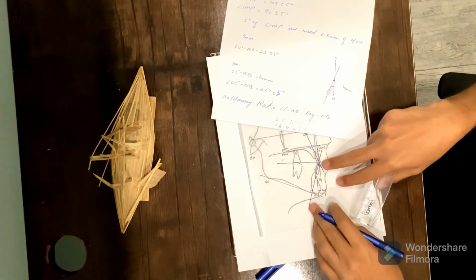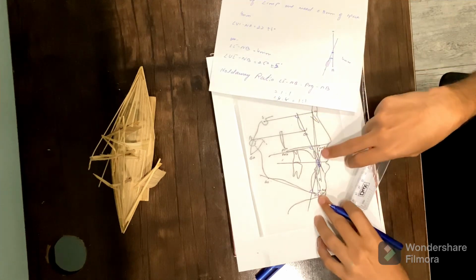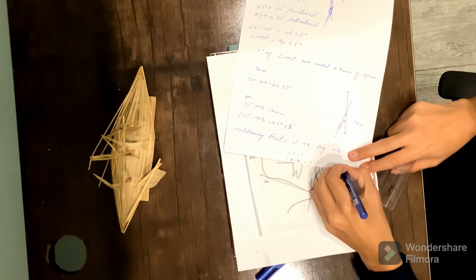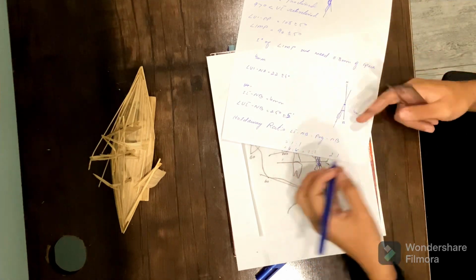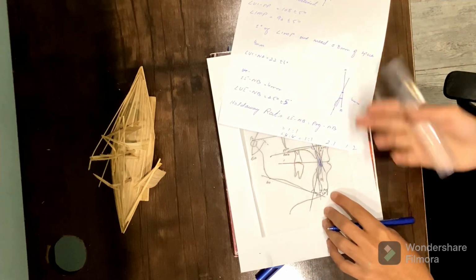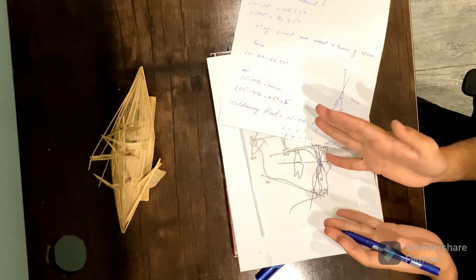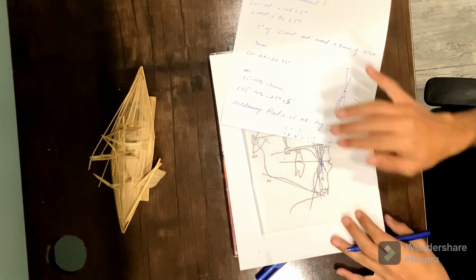So it will tell us the relationship of the incisor and the chin prominence with relation to each other with the help of the NB line. If the ratio is, let's suppose, 2:1, it will tell us that the incisor is more proclined as compared to the chin, and vice versa. If the ratio is 1:2, it will tell us that the chin is more projecting outward as compared to the incisors. I hope this is clear now, what the Holdaway ratio is. And this is all the dental analysis.